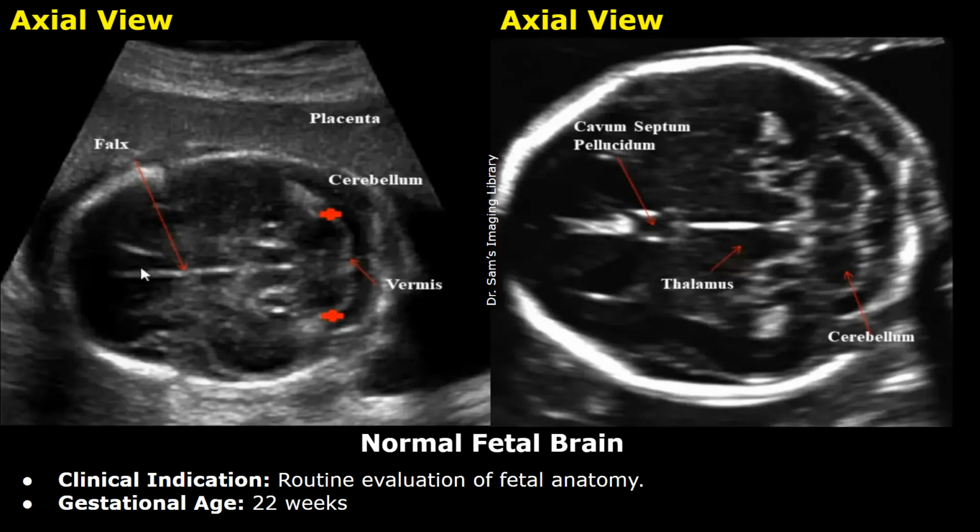You will learn how to write ultrasound reports regarding fetal brain pathologies. The reports will mainly include the clinical indication, gestational age, findings and impression. The reports are related to fetal brain. Keep in mind that these examples are not of a complete obstetric ultrasound report. We mainly focus on brain pathologies.